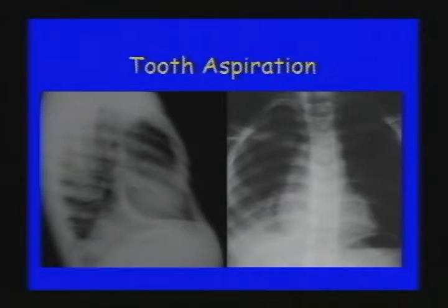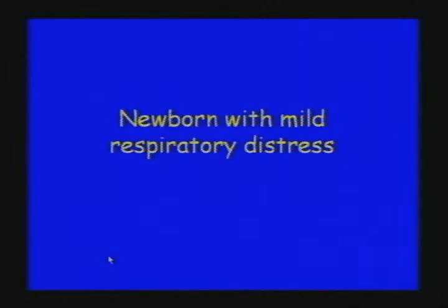You can have complete obstruction and result in distal atelectasis. Here you can see that there's a radiodense foreign body in the bronchus intermedius, and we have collapse of the middle lobe and lower lobe. I've actually seen several cases where motor vehicle accident patients have aspirated teeth. So always watch for that in the kids that come in and adults from motor vehicle accidents, especially if they've hit their face on the dashboard.